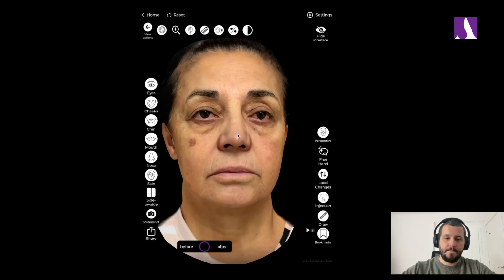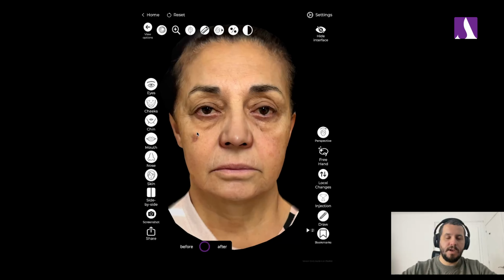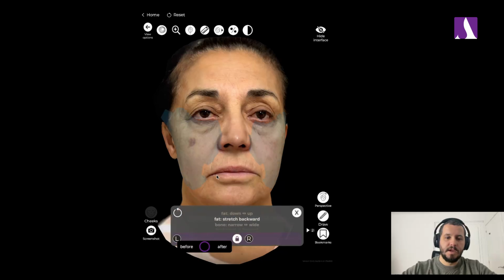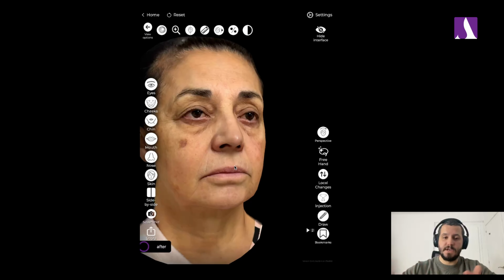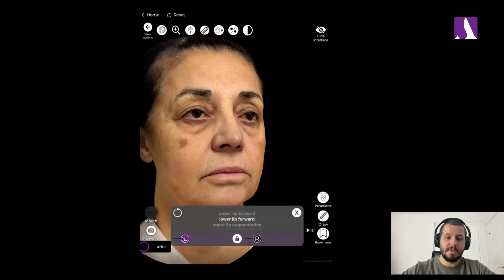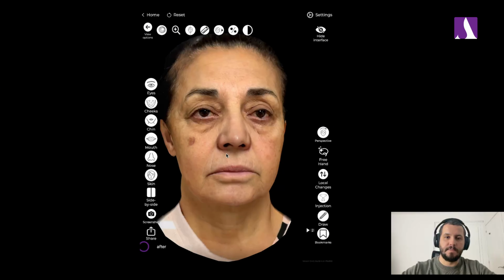Now, on the left bar, which means here, I find all the options that are pre-made. Depending on the case that we have in front of us, we can choose, for example, automatic options in order to promote some results, as you can see. They are not going to be possible to use in every case, of course. All human beings are different, but they come with a lot of options. They are going to be extremely important for us to show to different patients depending on the time.